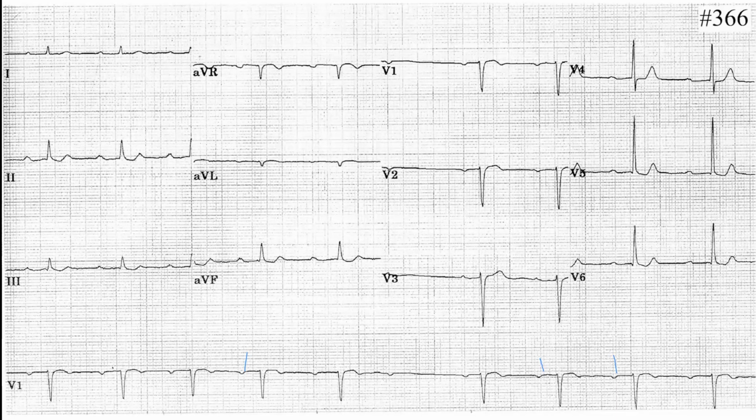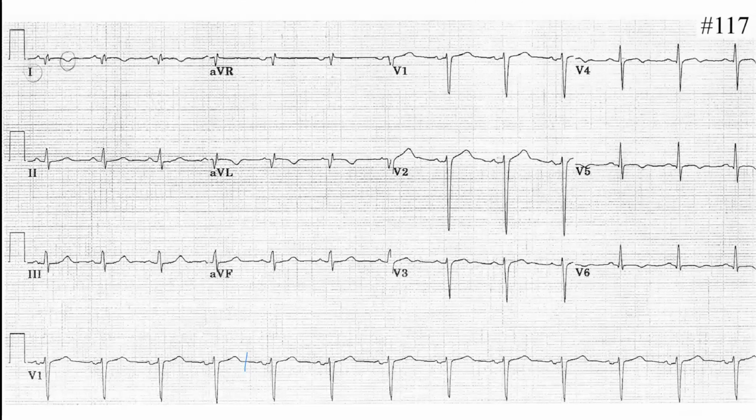So that means nothing else. That's it. Only we had a second degree AV block, Mobitz type 1. That's it, period. All right. Thank you. Next one goes to Amit. Yeah, hi. Okay. Your turn.